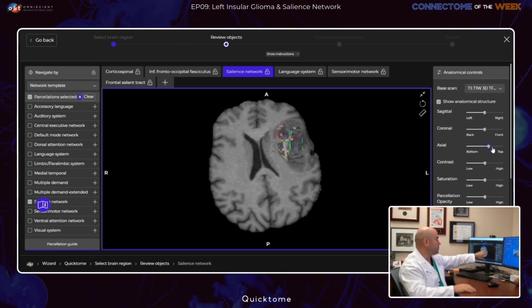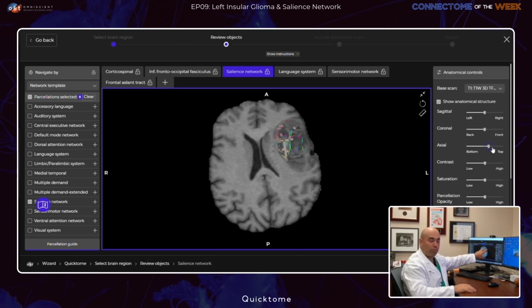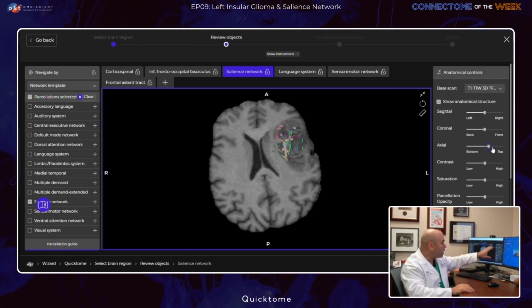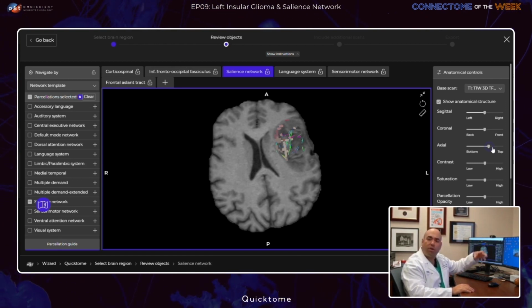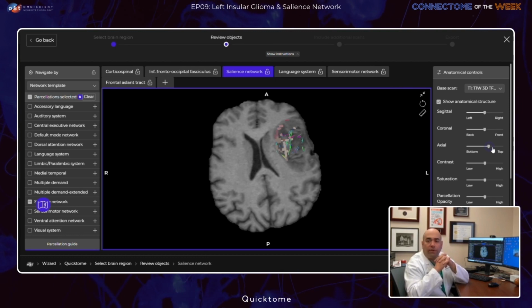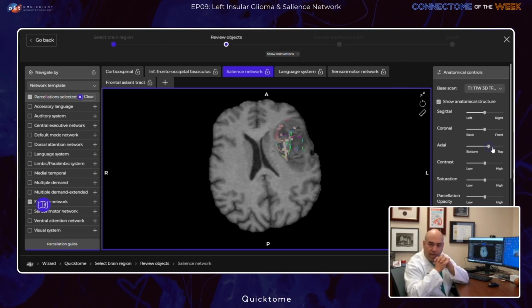But this is not a circumstance where the Quicktome shows that these parcellations have been cut out or lost. They are there, they've just been disrupted, desegregated, if you will. So that was one of the learning points for me in this case.